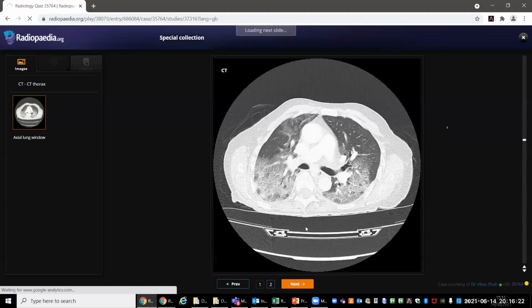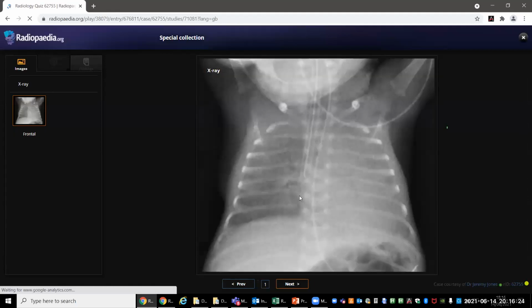And the last one, you also did it very well. I would advise that we all start with the tubes. When we see any chest with tubes, before we start going to the abnormality, but you still did the right thing. You still noticed it was low lying, and yes, the right thing to do is to immediately call the clinician for them to withdraw this so that this can get reaerated.